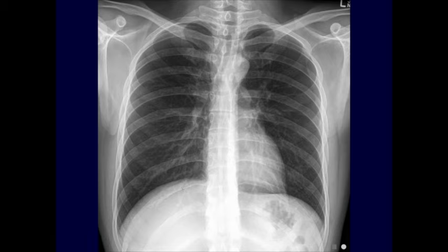Lastly, when someone says a film is overexposed, it means that too many x-rays got through and were detected on the film. So if a film is overexposed, it generally means that it looks too dark, and an underexposed film usually looks brighter. So it's the opposite of what we usually think with photography.